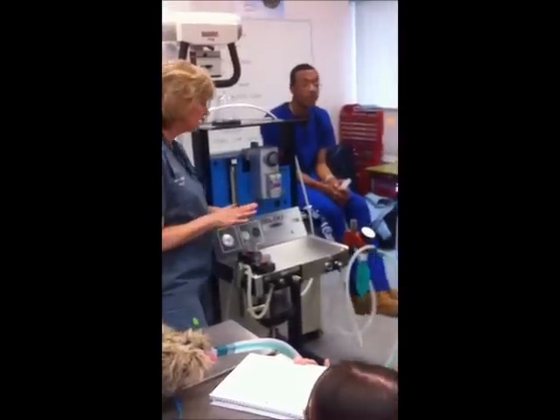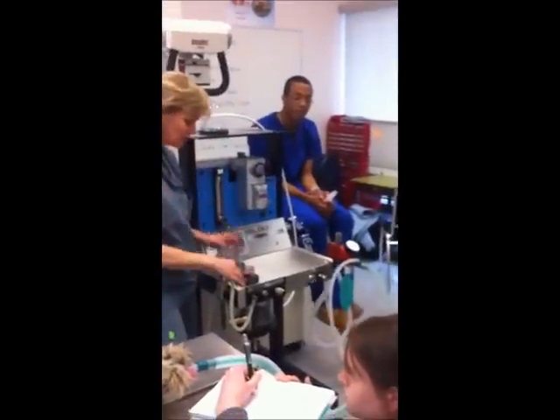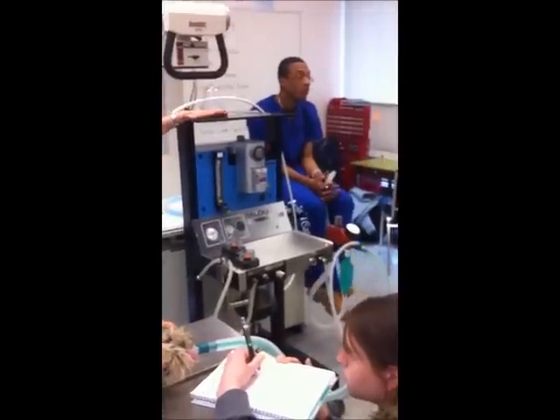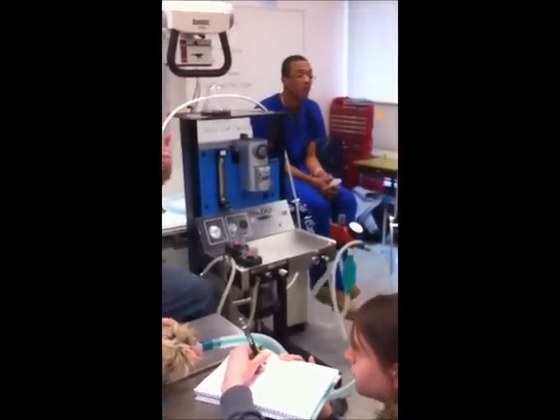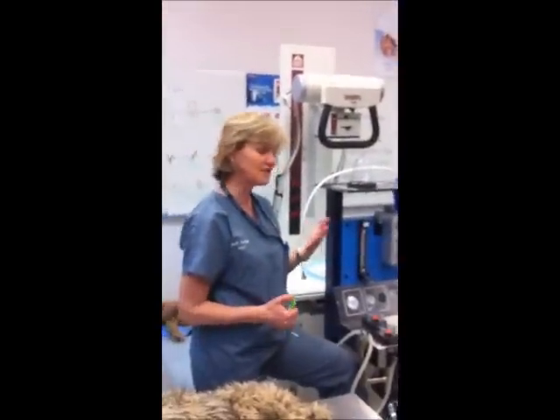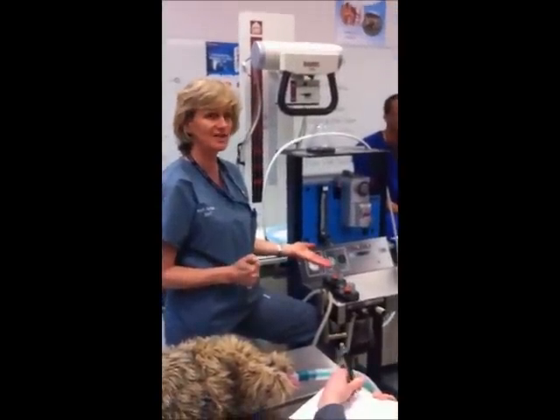So, you've gone through sort of both systems. I just want to make sure that you're clear on what you're going to be tested on when you come in for your practical next week. So you're basically going to be coming in and given a case study like we have with every other thing that we've done this semester. What's the first thing that you should be looking for when you get that case study for the setting up of this anesthetic machine? How much they weigh?